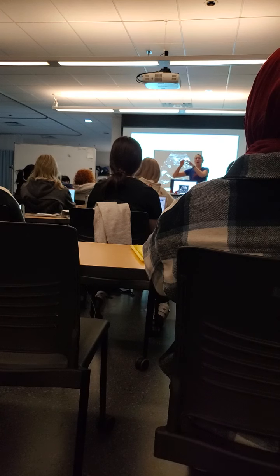And pneumobilia is due to bacteria traveling up the biliary tree. It's gas producing, so it's like, I'm gonna hang out in the left liver lobe and make a bunch of pus and gas, and then our beam reflects significantly off of it. We may have some of that gray hazy shadowing as well, though this isn't the best image for it.